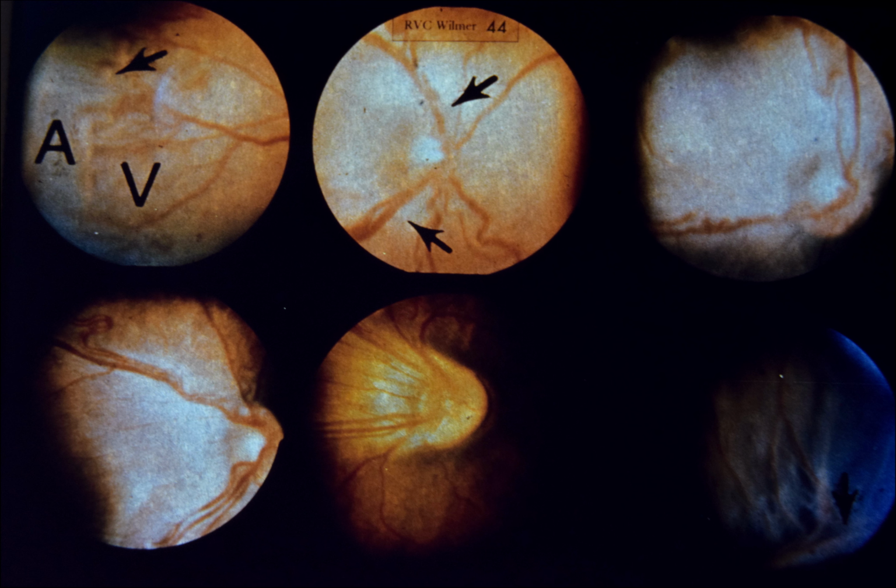Upper left, in temporal periphery near equator, note intravitreal neovascularization just posterior to demarcation line between vascularized retina V and the more anterior avascular retina A. Arrow points to globular-like bodies, which on histologic section are nodules of proliferating endothelial cells.